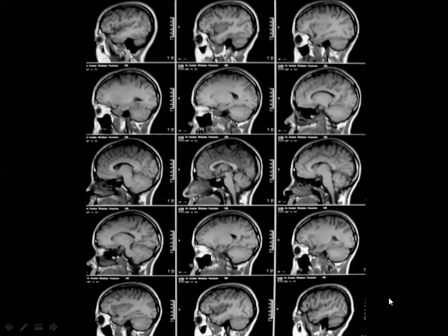Then you know that MR images start from the sagittal images, start from the left and end on the right side. Then this is the left image and this is the right image. So this is the left frontal lobe, left parietal lobe, left temporal lobe, left cerebellum. And if you reach the midline, you cannot know exactly which lobe is this one, the left or the right.